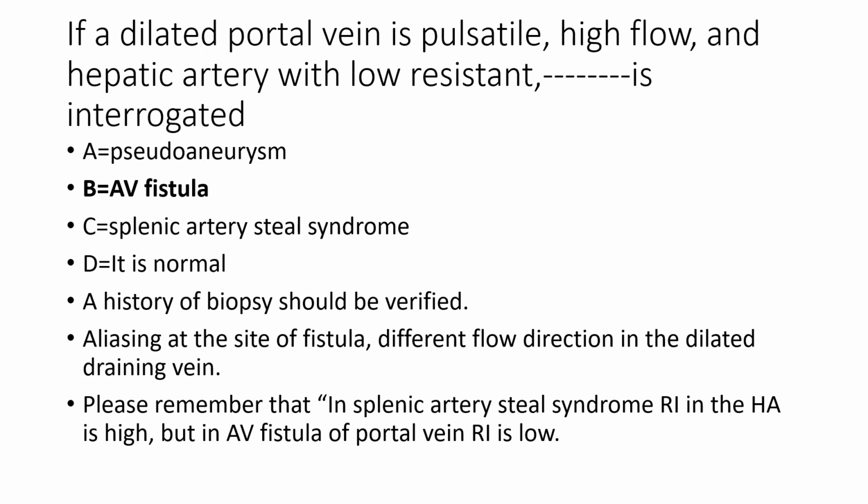If we do a biopsy, an AV fistula or pseudoaneurysm may occur as a complication. So here we think about AV fistula, and the size is very important, high flow and pulsatile. It is a fistula with the hepatic artery.